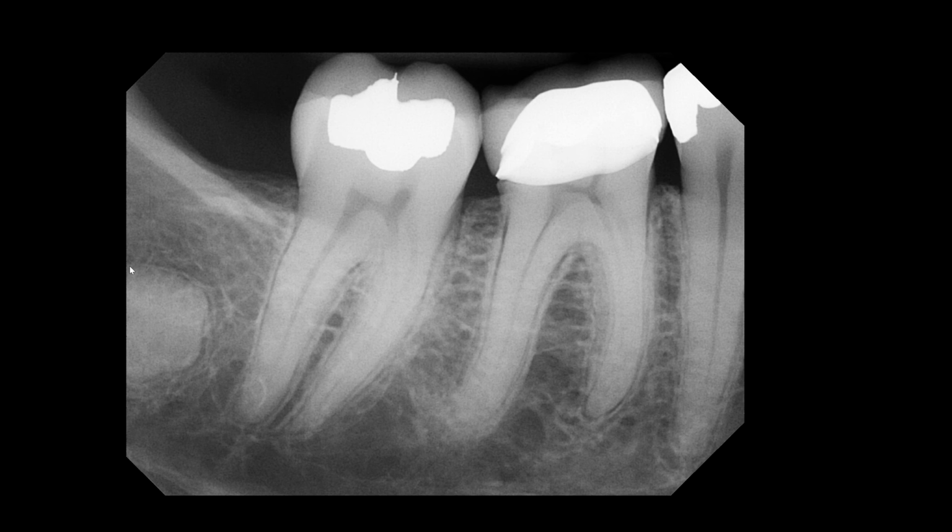You could argue that we could also consider a mature stage of periapical osseous dysplasia, which I can't exactly rule out either. But if I'm going to rank it, because it's at the site of number 32, and also this patient is, depending on how you look at it, relatively young, in their 30s, a mature stage of periapical osseous dysplasia is possible, but less likely.